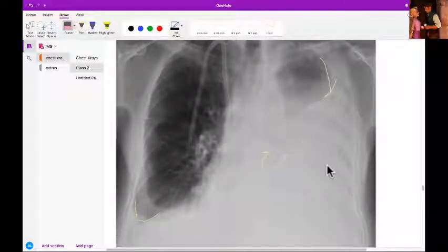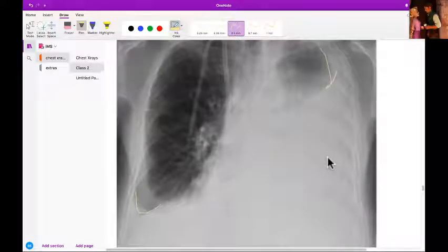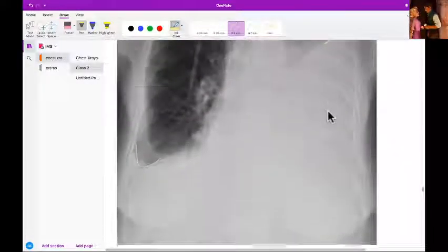So basically, as I said, air bronchogram is a definite indication of some intrapulmonary pathology. Okay, so there's something present inside the lung tissue. I think it's not visible in your stream, but when you see the file, it'll be more visible. That's how it is. Okay.